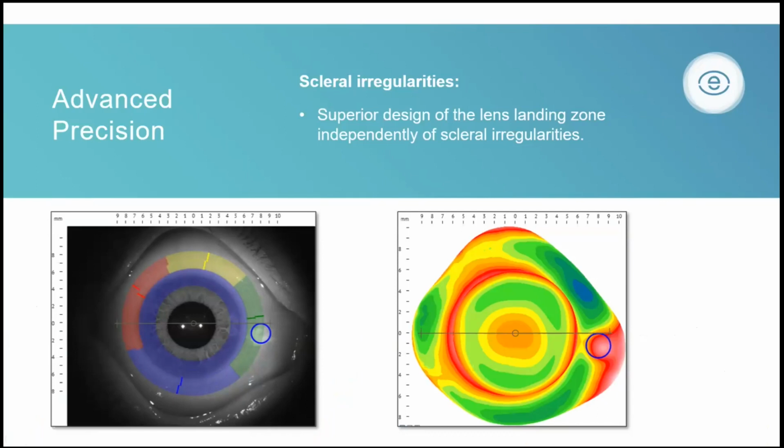And just a little recap. With the Scleral profile map, we try to give you a feeling for the shape of the eye in just a split second. In this eye, if you're looking at the limbal zone, you see the blue rings, indicating that the limbal zone is spheric in shape. If you're looking at the outer rings, you see 4 colors, indicating it's quadrant specific. However, the pinguecula was hiding there. So we're going to plot this blue circle, indicating that there is also a pinguecula present.